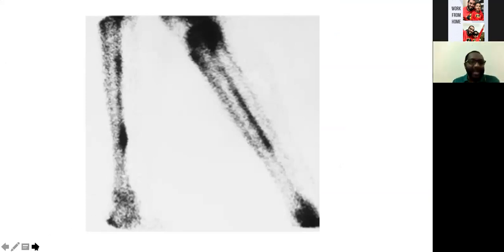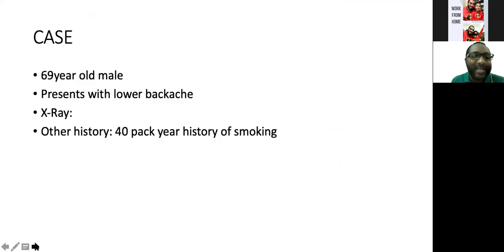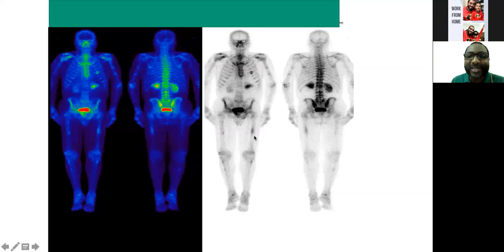Another thing is about stress fractures. If you're looking at stress fractures, please always look at the tibia, because the commonest site for a stress fracture is the tibia. By the time you get stress fractures in the femur, it has already affected other sites, so you will see other similar lesions. These are things that will help you make your diagnosis by exclusion. The majority of stress fractures involve the tibia. Okay, thank you.